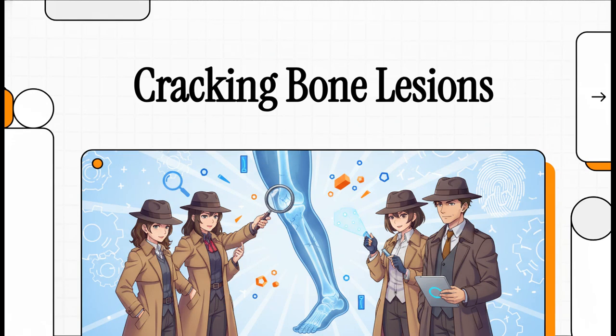All right, for this explainer, we're going to put on our detective hats. We're stepping into the world of radiology, but we're not just looking at medical images. We're treating X-rays like a crime scene, a place filled with these subtle, hidden clues that tell the whole story of what's really going on inside a bone.